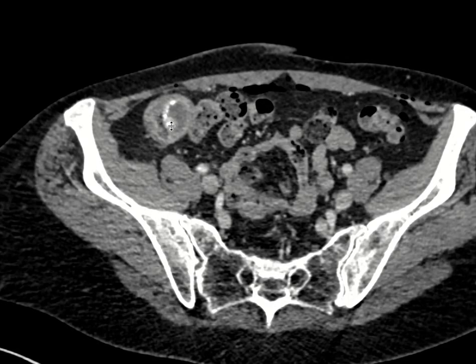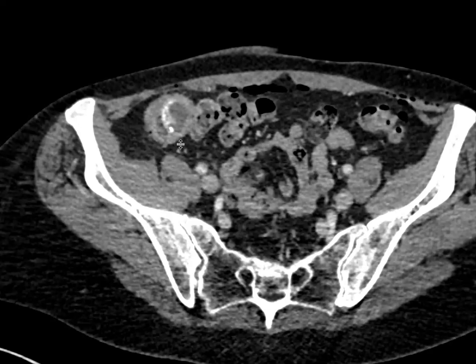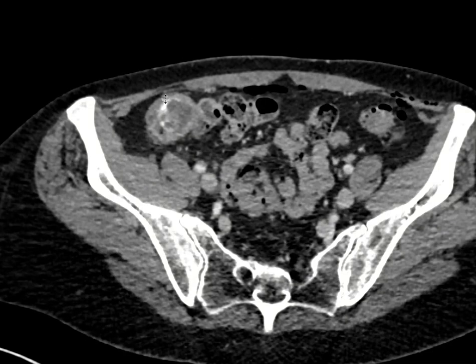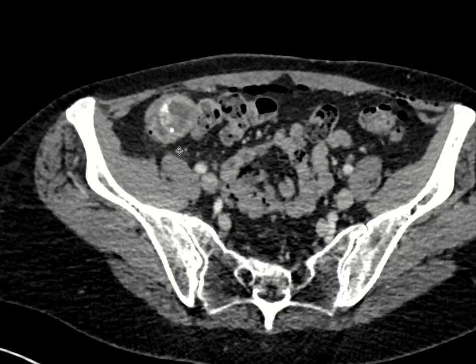The calcifications help support that. Mucinous tumors typically have a calcification associated with them, but you can also see calcifications with an appendicolith. So it's important to make sure that these calcifications are sure enough along the edge of the appendix rather than representing an appendicolith.